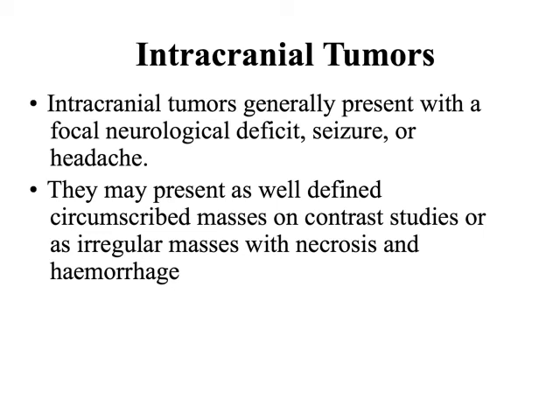Without contrast, we sometimes have a difficult time seeing these things. They might also be irregular masses with necrosis and hemorrhage, so there can be necrotic centers, which is common for cancer, or with contrast we may be able to see neovascularity, where the tumor has actually created blood vessels to feed itself.